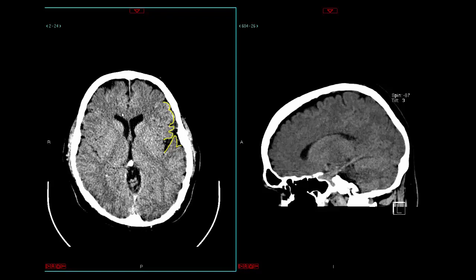Remember, it's at the level of the corpus callosum. Here's the genu here. You can see the internal capsule here. This is going to be the inferior frontal gyrus, especially on the left where Broca's area may be. We get a little bit of an idea. This connection here would be the insular cortex, and ultimately we're getting into the temporal lobe here, which I'm going to make a few comments on as well. But important to recognize that as the inferior frontal gyrus.